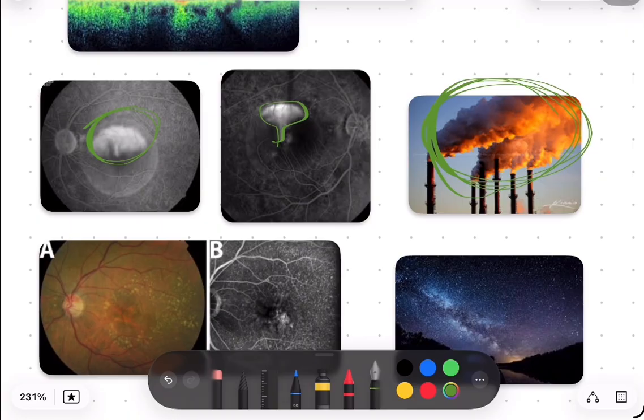your central serous retinopathy. And central serous retinopathy is where you have serous detachment of the neurosensory retina because you have a retinal pigment epithelium leakage. Okay, so if you have a serous detachment of the neurosensory retina due to a retinal pigment epithelium leak, then that is central serous retinopathy, which is seen in a young male or steroid use or stress. So you will see this dome shape elevation, okay, a dome shape elevation. You see a dome shape elevation on the, or smokestack pattern as they describe it.